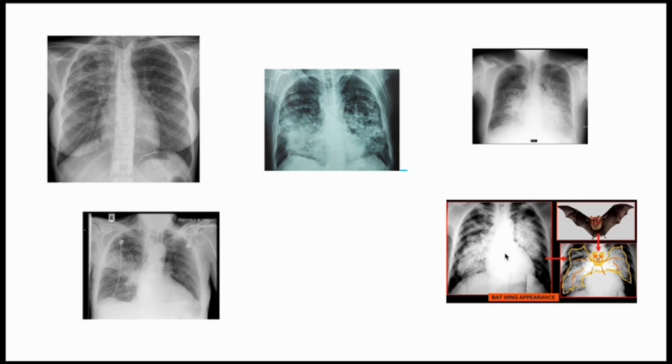Now, pulmonary edema may be cardiogenic or non-cardiogenic. Again, we want to look at the cardiac shadow. Just like you see in this image here, the cardiac shadow is relatively enlarged, and then we have the alveolar type of infiltration, centrally placed, fairly sparing the apices and the bases, and this is pulmonary edema. Here again, the distribution is due to the raised hemidiaphragm. Again, we see this is most likely a lobar pneumonia, with consolidation and collapse there.